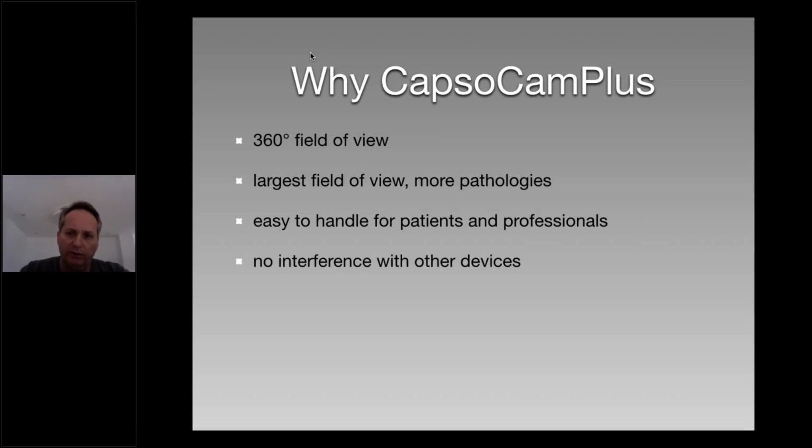You have no interference with other implanted devices or even with handy computers, WLAN, whatever you want, because there's no emission of the capsule. All the data are stored on board. And it's the best comfort for the patient because you don't need a sensor belt. You don't need a data recorder. No one will see that there's an examination ongoing in the patient with the CapsoCam.